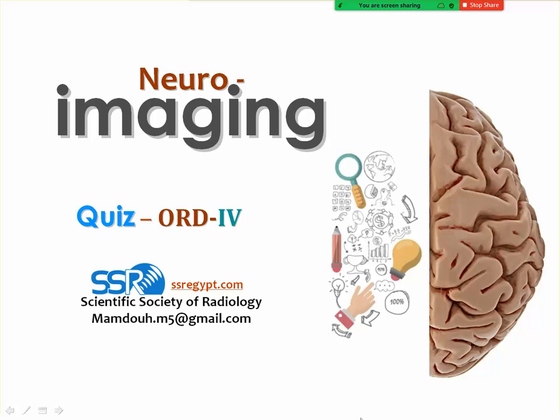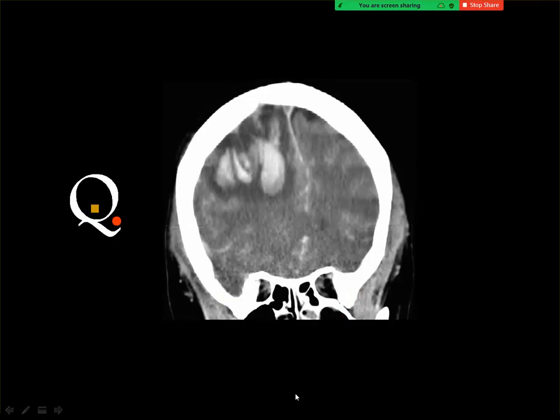And this is the first case. It says coronal CT scan of the brain without contrast.